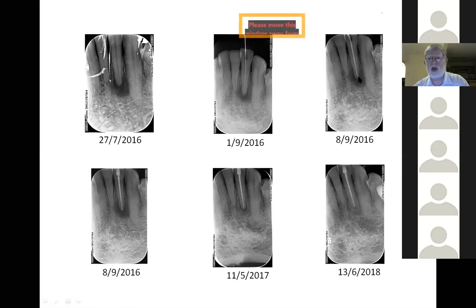This is my try-in of my final point and the obturation a week later. This is now a remarkable improvement in the space of about 8 months. A lot of that lesion is disappearing. And less than 2 years later, almost complete resolution of that.